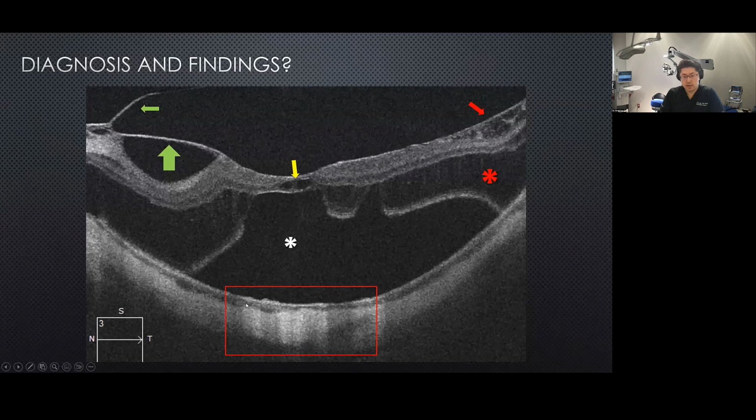Like we discussed, there's thinning of the choroid, which is associated with high myopia and staphyloma. And we can also see this hypertransmission. The reason you have this hypertransmission is because of myopic maculopathy with loss of RPE. And when you have loss of RPE tissue, then light penetrates better. So that also gives you a visual prognostic feature that even after surgery, vision will not be 20/20 or close to 20/20 because of myopic macular degeneration.